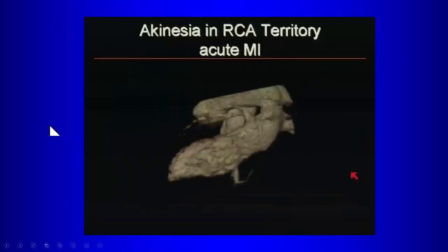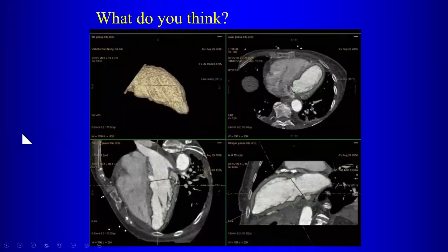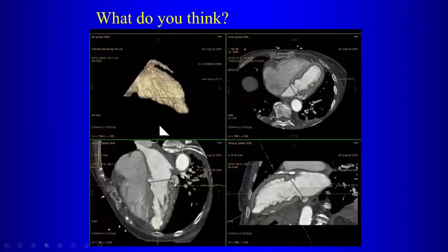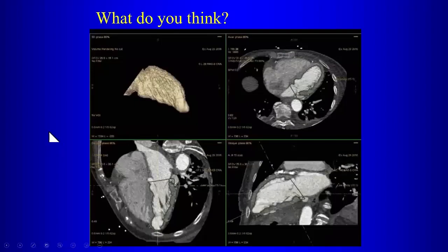All right, now, for this case, who's over there at Beth Israel who wants to discuss this? What's abnormal here?